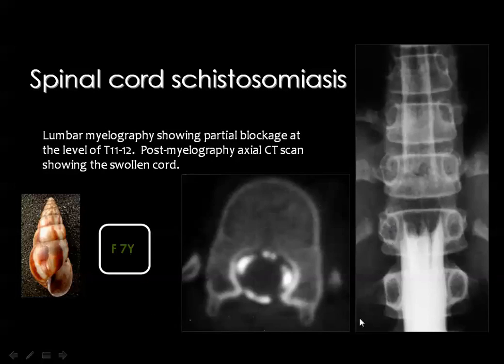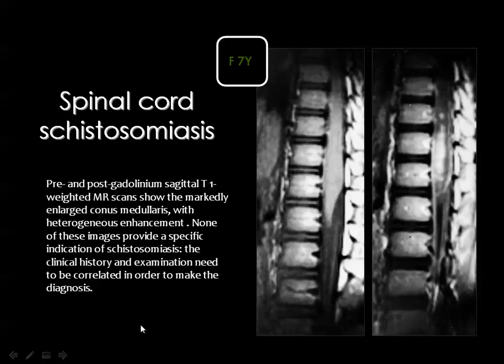In the old imaging, before the era of MRI, we used to do contrast myelography of the dorsolumbar region, and to support this by CT myelography. And you can appreciate that the conus is swollen, and here also you can see that the conus is swollen as indicated by attenuation of the contrast column around the region of the conus medullaris.